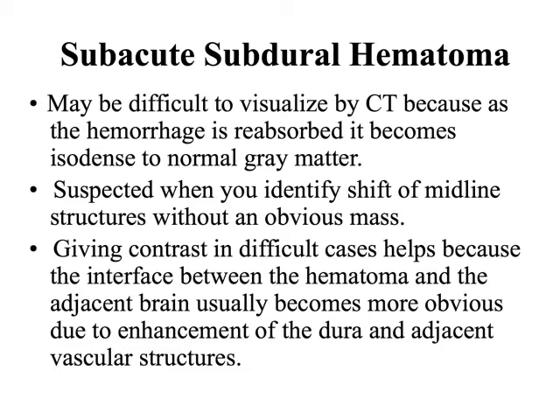Nevertheless, we can suspect it if we identify that midline shift without any obvious mass, like a cancer. At times with these, we may give contrast, because then we would be able to see the interface between the hematoma and the adjacent brain. Or the patient may be referred to MRI.